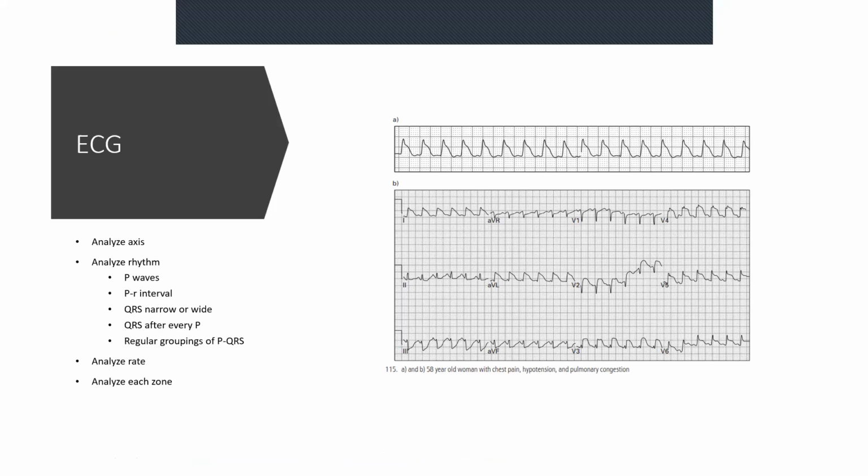So we haven't had an ECG presentation for a little while, and I decided this might be a good one for us to have a look at. It's quite an interesting one, not a particularly advanced one, but one that makes you think a little bit. So I hope you had a chance to have a look at the ECG and maybe came up with your own ideas of what was going on. So let's jump into it.